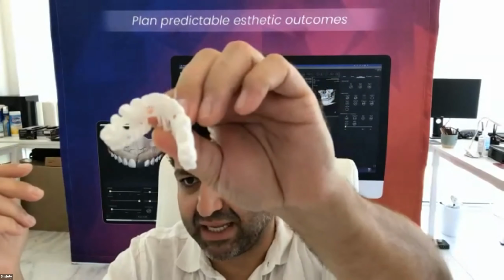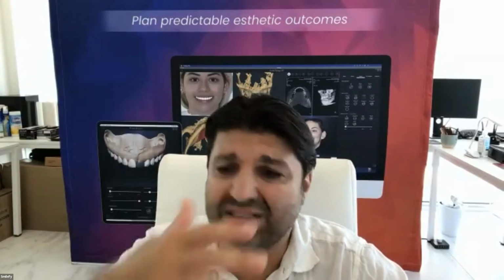What printer do we recommend? It depends on what exactly you want to do, right? If you need production, if you need speed, if you need volume, then you need to decide for a printer that prints very, very fast. With Nextdent, you can print things like this in 20 minutes. Shells you can print in 50 minutes. Mockups and all the stuff, we use it in our courses because we can print 16 models in 2 hours, and then we can work properly.